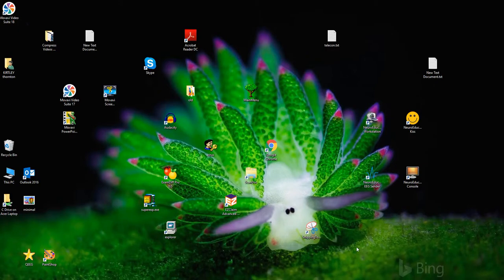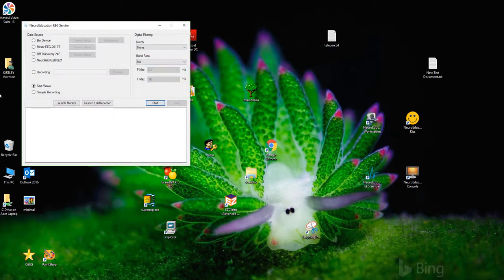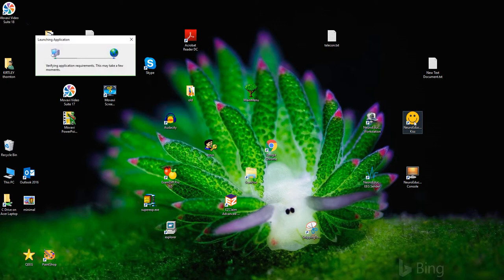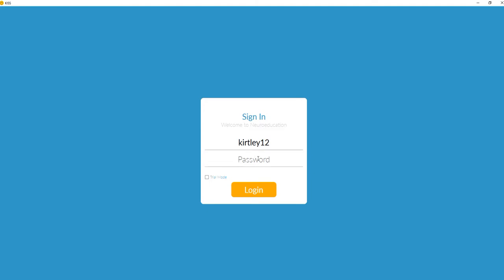Okay, today I would like to teach you how to create an extra variable in the biofeedback software. First, let's load up the Neuroeducation EEG Sender program and load up a sample recording so we have that going on in the background. Load up the Neuroeducation KISS program, putting in your name that you signed in to the business software with and your password. Set it to trial mode.